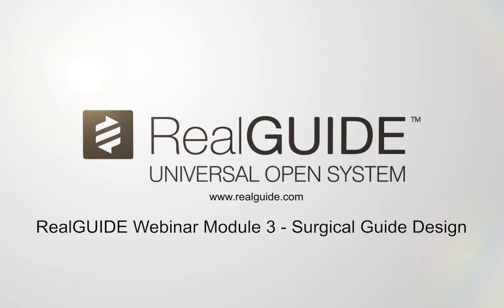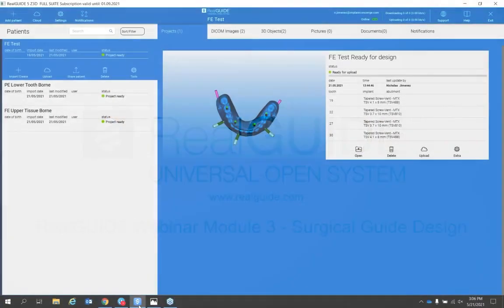So I am going to open up our RealGUIDE software. If you joined us in sessions 1 and 2 on Monday and Wednesday, we went over how to treatment plan these cases, a partially edentulous tooth-borne case and a fully edentulous case using the patient's denture. We have those cases ready to go. They are ready to be designed.